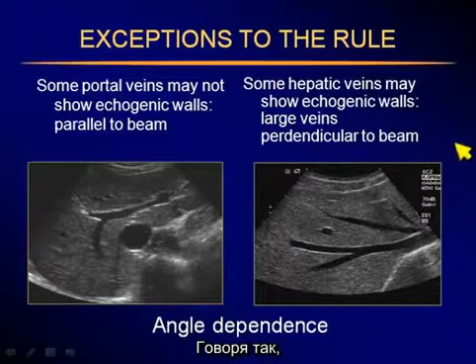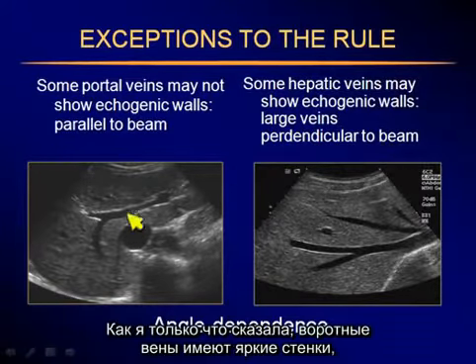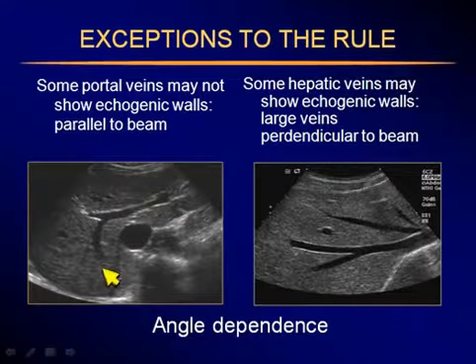Now, having said that, we always find exceptions to the rule. I just told you that portal veins have bright walls, and now all of a sudden I'm showing you a picture of a portal vein that does not have bright walls.